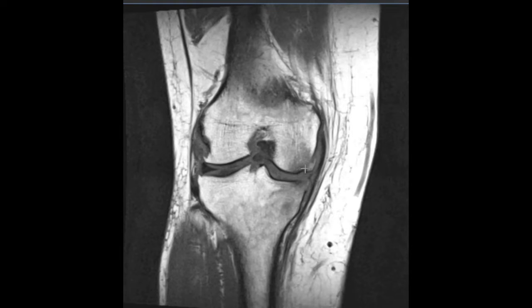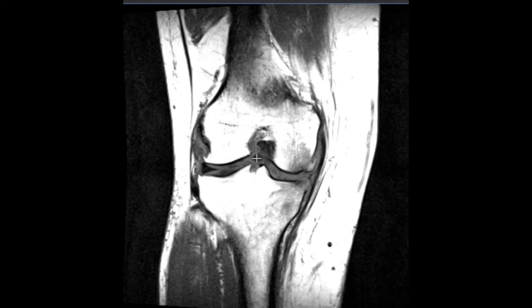You see the bone is kind of scalloped here, with a little bit of spurring, and the bone is dark. And the meniscus, instead of a nice triangle, we see just a little vertical band here, a little meniscus remnant. The meniscus is displaced into the knee, and this is a piece of that meniscus. So this is a large bucket handle tear, and this meniscus fragment is here instead of over here.